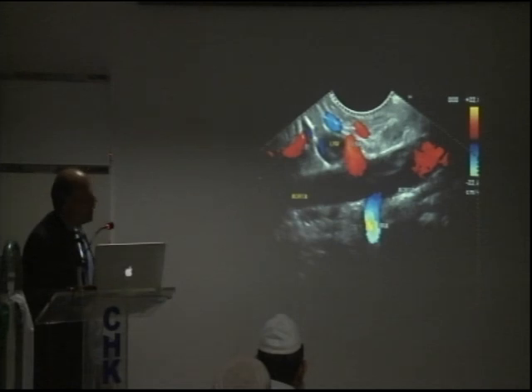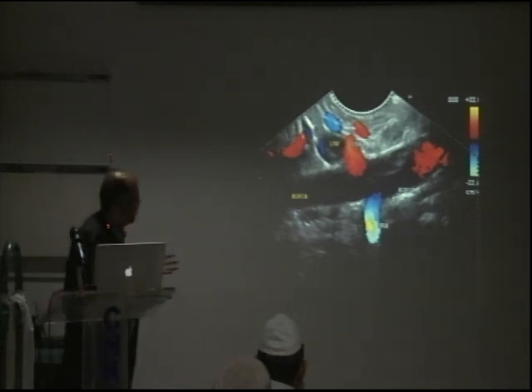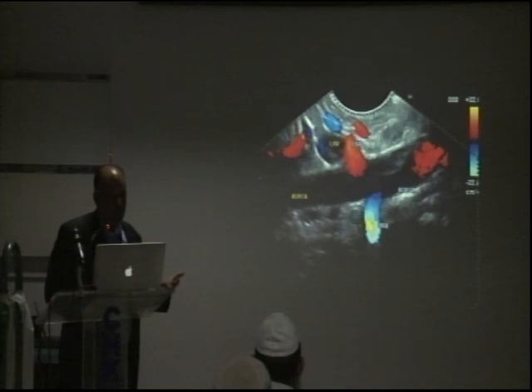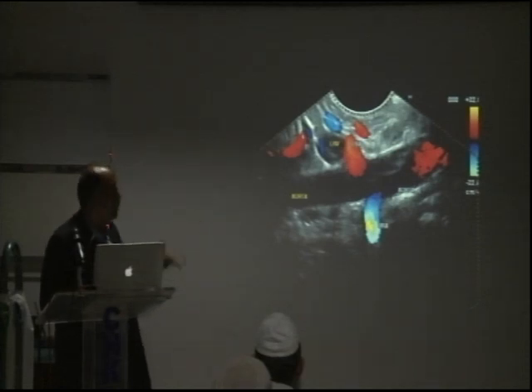This is how it will look. Just to give you an idea, you're not going to be able to get all these images in all the patients. Remember that. These are images in the books selected for understanding purposes. You will not be able to get them in all the patients all the time. So it's just to make you understand the orientation.